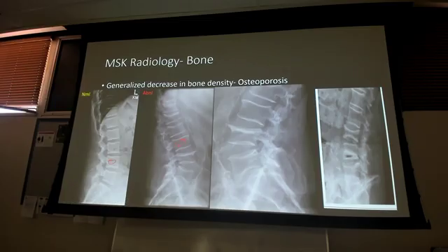Most of the time with your lumbar spine x-rays, this is how you're finding osteoporosis if the patient doesn't know they have it. This patient came in with back pain. The back pain is likely due to these compression fractures, and we'll see more compression fractures in this block, right? Where the vertebrae is basically getting smushed down. It's having a lack of density from the osteoporosis, so from the weight, it gets smushed, it gets compressed. So it's a compression fracture, and that causes some pain. You get the x-ray, and you can see how much darker it is compared to my normal lumbar spine.